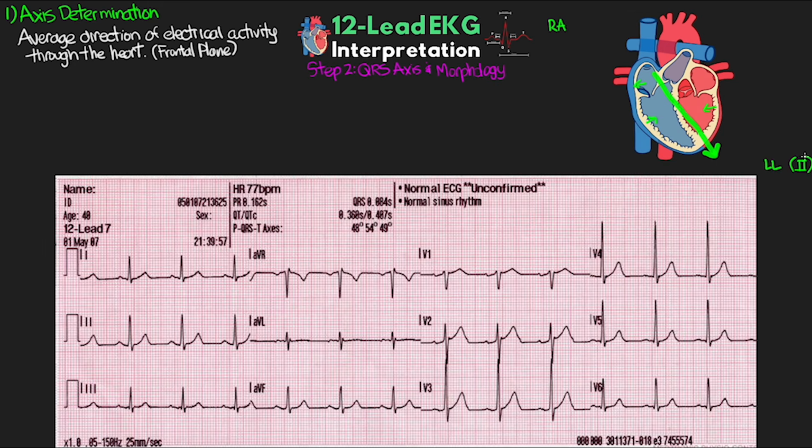which if you remember correlates with lead 2. So remember from that last lesson that we're going to see a positive waveform if we're moving towards a positive electrode, thus we expect to see lead 2 positive. So knowing that, we can look at the direction of electrical activity in relation to various leads to try and determine if we see positive, negative, or biphasic waveforms on our EKG tracing. Then we can actually use this knowledge to determine the direction of our patient's electrical activity, aka their axis.